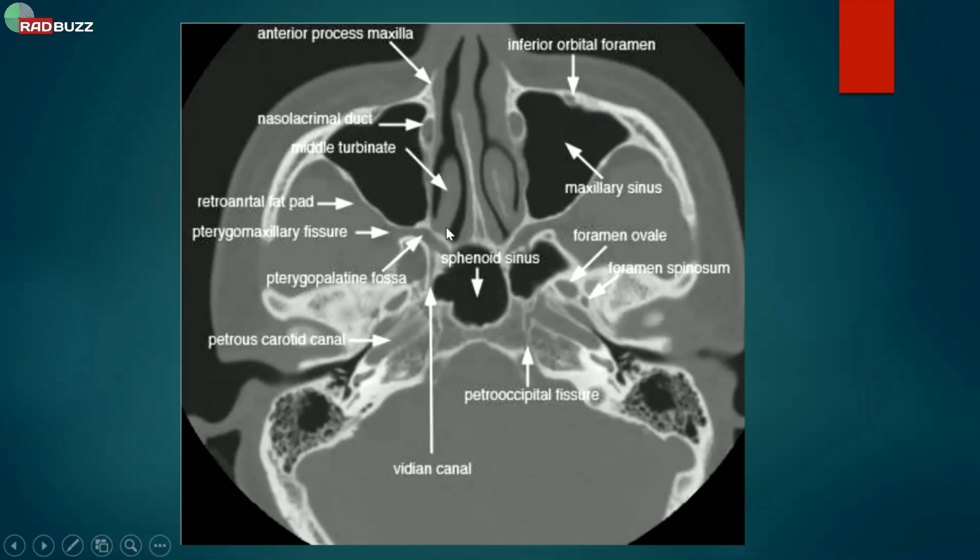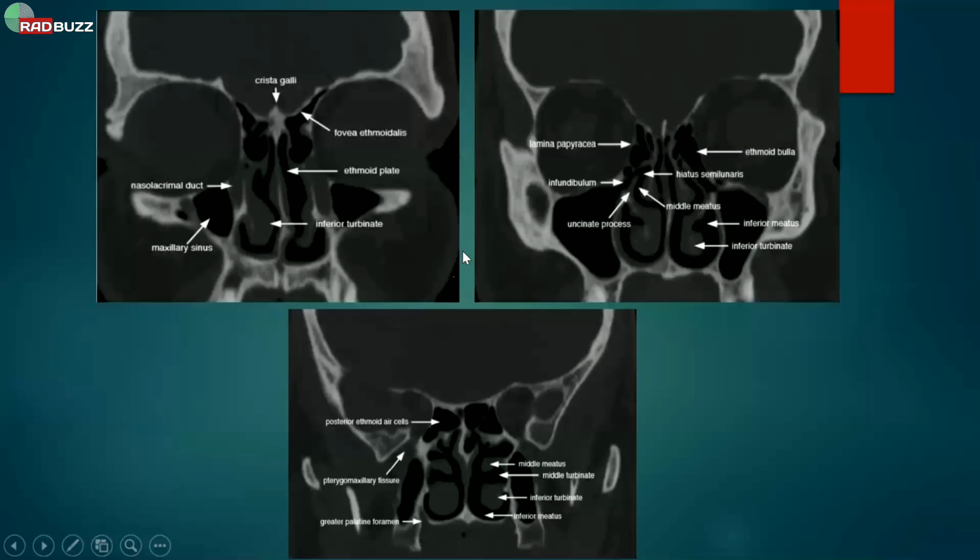The turbinate hypertrophy or turbinate pathology or any other thing should be reported on coronal images, how they're going to look like. So these are the three sections from anterior to posterior coronal ones. Here these are the orbits, that's the most anterior part, and we see a little bit back where the structures are going away. That's the globe basically, and we can see the optic nerve here and the muscles, and posteriorly the nerves are basically gone, just the orbital apex is there, and we can see the sphenoid sinuses and posterior parts. Now this midline structure, this one is crista galli.